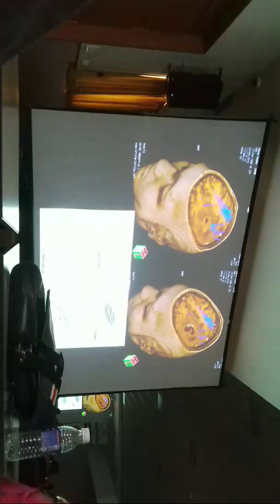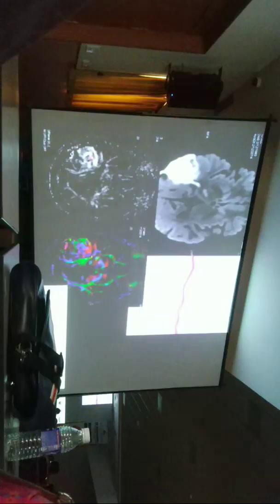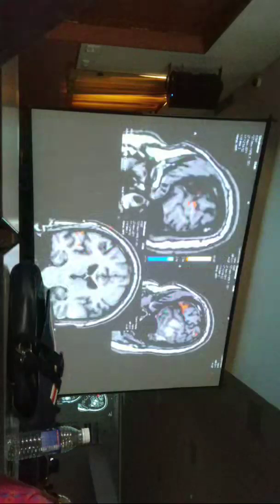In this patient there is actually destruction of the white matter tract. When you compare with the opposite corticospinal tract on this side, that lesion is infiltrating. Another example is an epidermoid, where you can see color within the lesion, because multiple fibers are there, you can get color flow within the lesions.